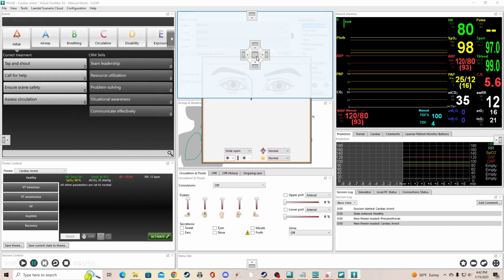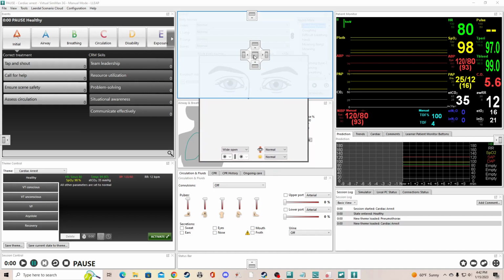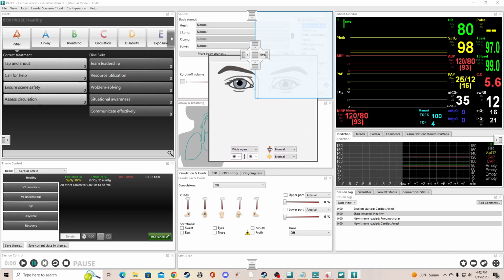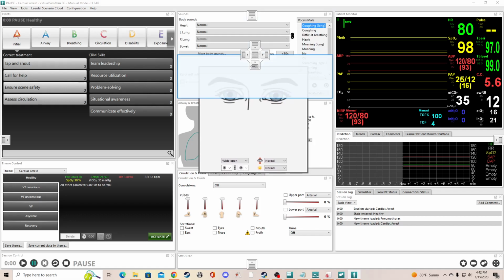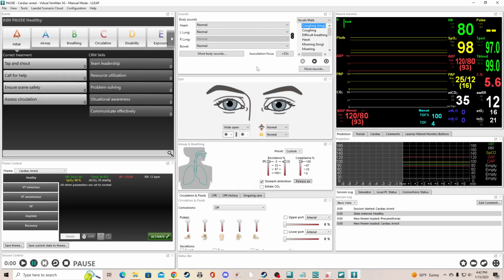Anytime you hover over here, you can say, do you want it on the top? Do you want it to be overlaid? Do you want it to the left? Do you want it to the right? All that. And whenever it squishes something, it will often take buttons away. So just know that you do lose something whenever you do that. So see, one of our sliders is gone, but we can actually make that show back up as you can edit how much distance this is.